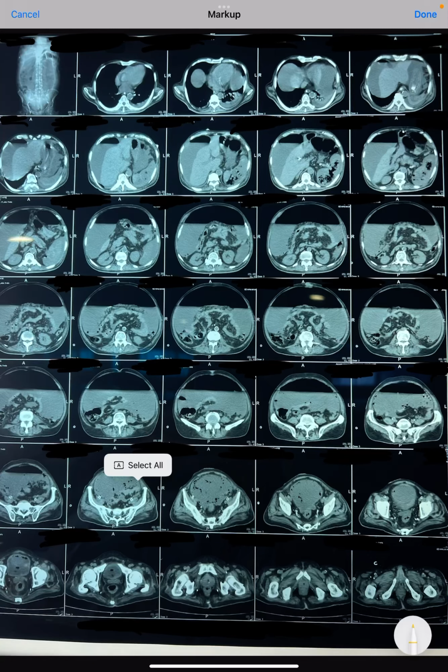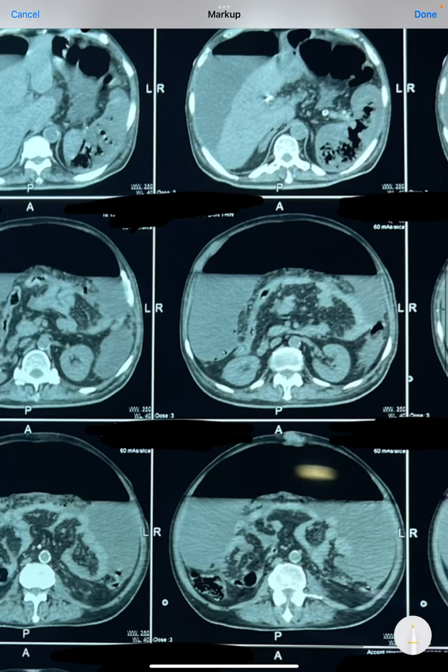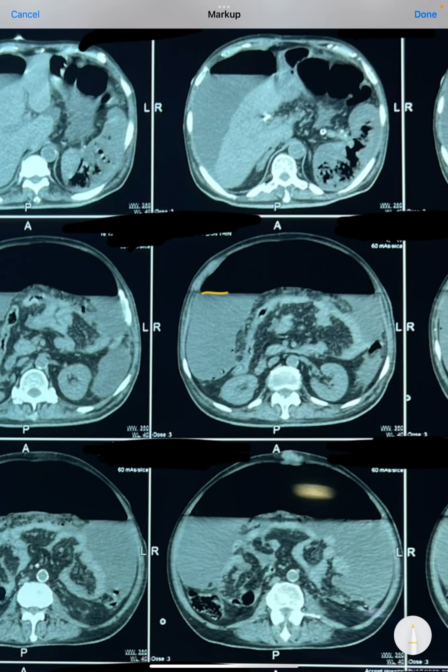Now this is one of the very challenging CT scans of the abdomen, where we can see so many different unique findings. As soon as we start reading this CT scan, when we zoom in, the first thing we can notice is this blackishness. I have told this so many times: the most black structure on the CT scan is air. So this is as black as this.